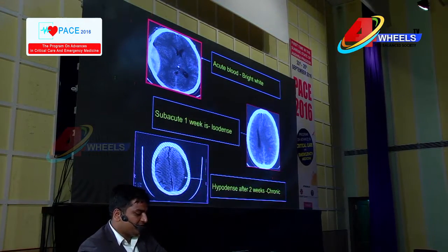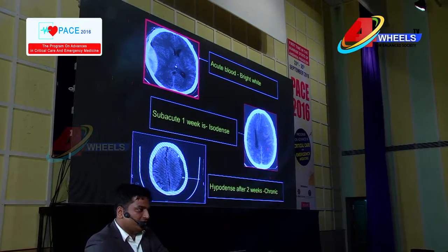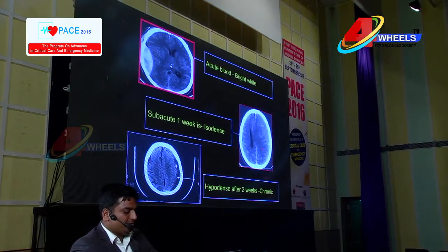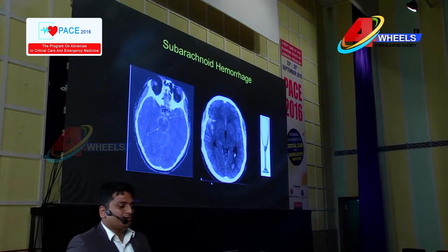Again, this is also SDH. Do not confuse it with an infarct. Infarct will be territory based. This is an SDH, which is a chronic bleed, so usually it will be 2 weeks old.